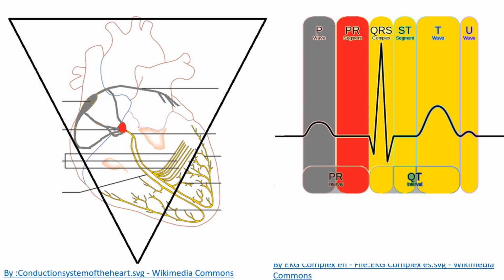All right, so next thing we have is ventricular pacing. Once again, you've got your pacemaker right here, and we're going to have wires over here. This thing fires, electricity is moving down here just fine, but electricity doesn't make it into the ventricles. So we're waiting for it. All right, time's up. Where's my QRS? I'm not seeing anything. All right, now I'm going to start things.